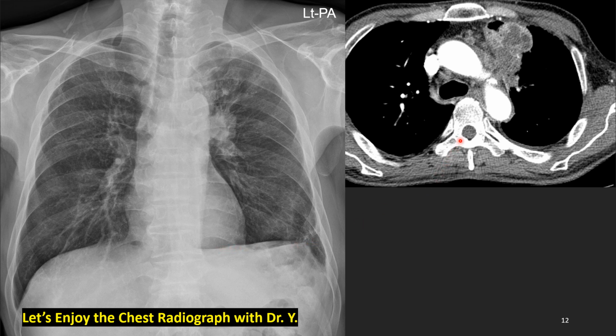Let's see this axial contrast enhanced CT. Yes, more than 5 cm left upper lobe mass, broadly attached, invading the mediastinum, and here is the phrenic nerve course, so possible invasion of the phrenic nerve, and several small mediastinal lymph nodes here. So lung cancer of the left upper lobe with mediastinal invasion and ipsilateral lymph node enlargement, T4 and N2 at least.